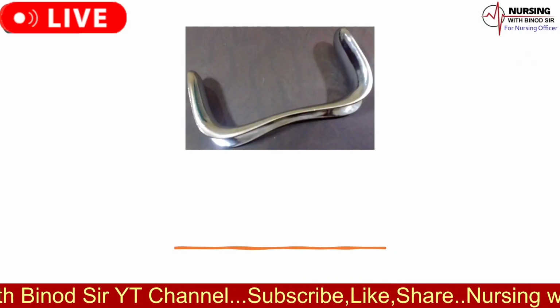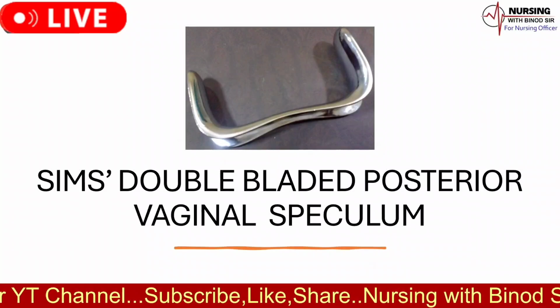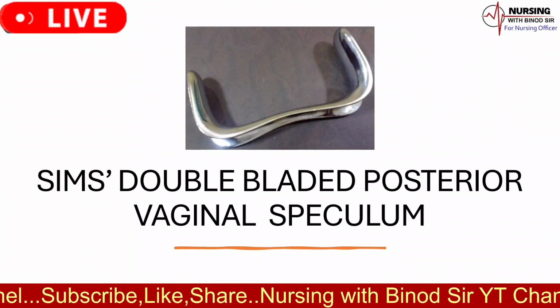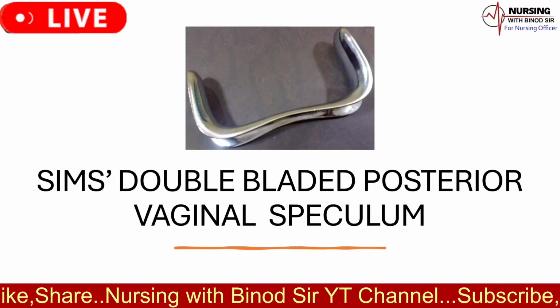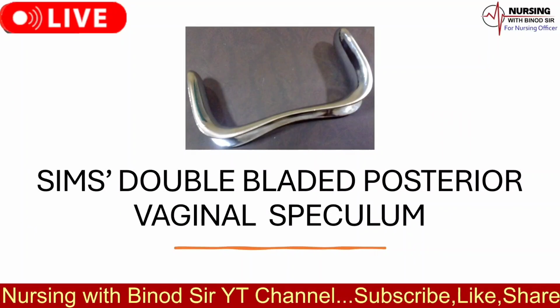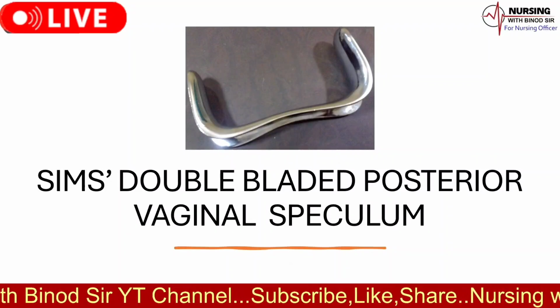The name of the instrument is Sims double-bladed posterior vaginal speculum. The blades are of unequal breadth to facilitate introduction into the vagina depending upon the space available: the narrow blade in nulliparous and the wider blade in parous women.